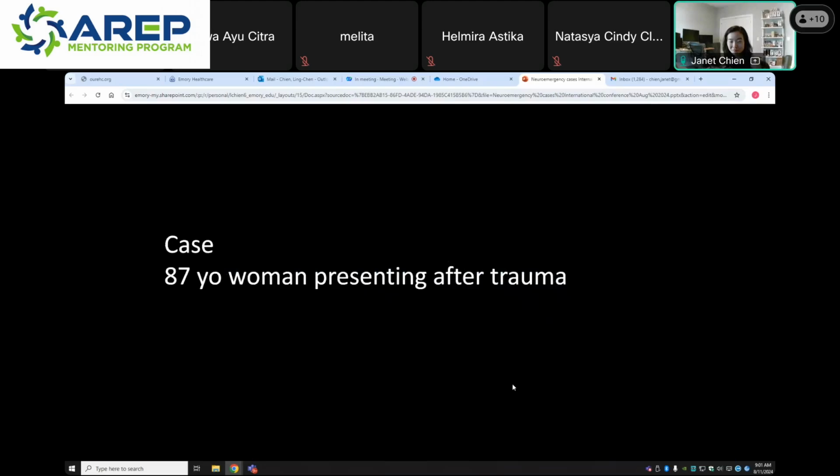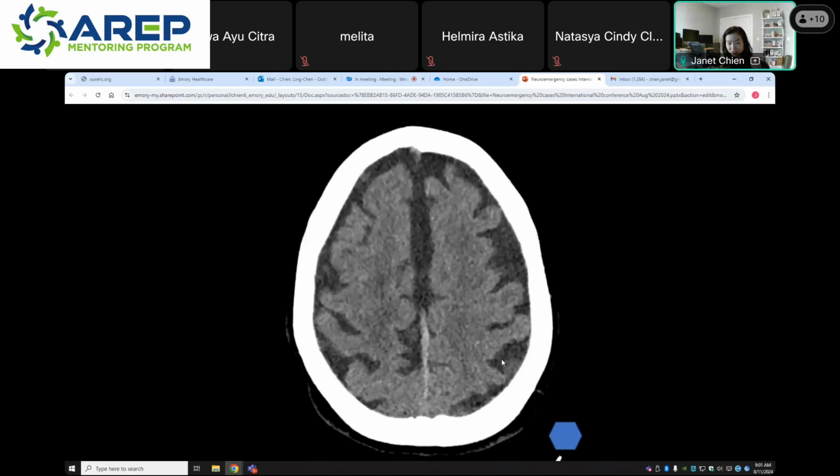Case. It's a relatively easy one. 87-year-old woman presenting after trauma. Who would like to take this one? We've got lots of cases to go through, so if someone would volunteer, that'd be great. You can just shout out what you see.